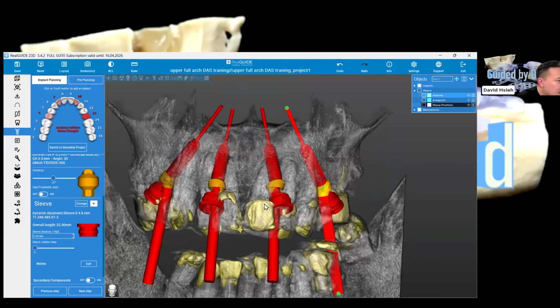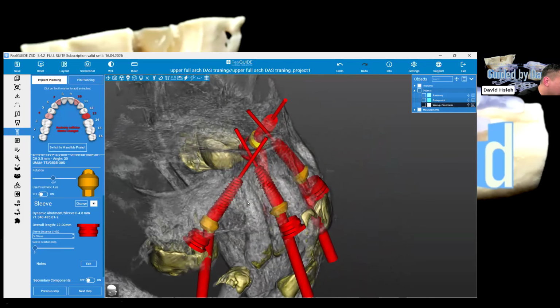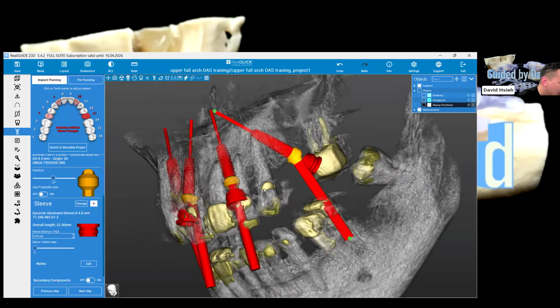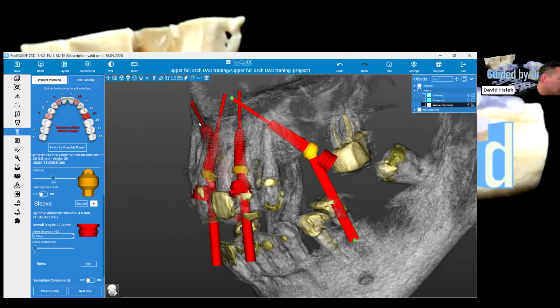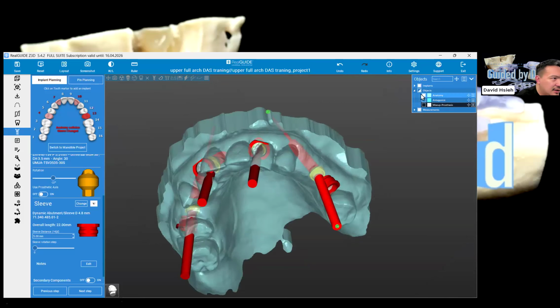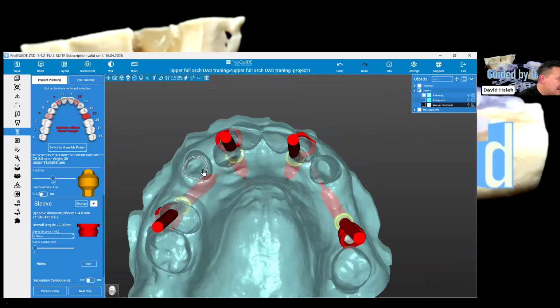stabilization there. So what I would do is keep this canine because it doesn't touch anything, and I will keep this canine, right? Those two canines will stabilize the whole orientation of the guide. All right. So to do that, I'll keep this canine and that canine. Other than that, I'll remove all the teeth, meaning digitally extract them.